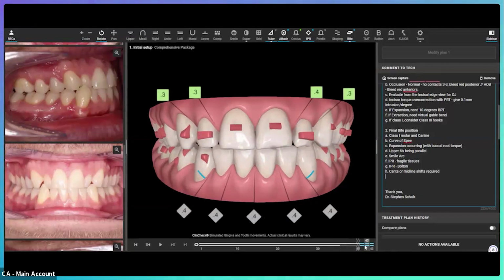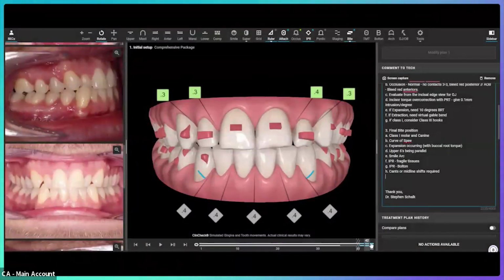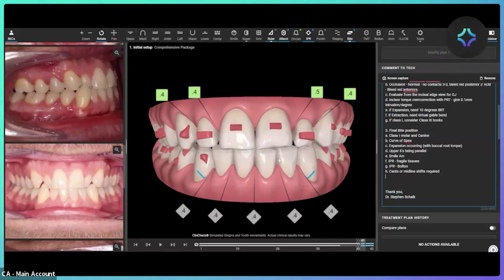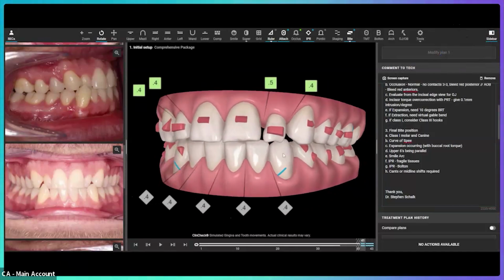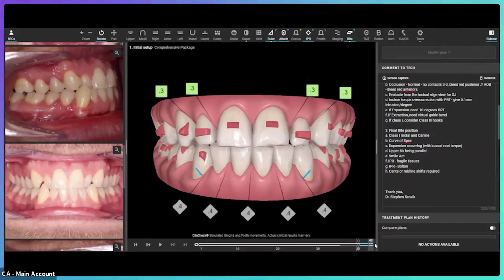Now in this case, I did something that I think is stupid. I'll call myself out: Steven from the past was an idiot. Here's what I did that was stupid. On the bottom, you see these blue 3 trays, which are overcorrection trays. Here's why this is stupid. I've asked the technicians to give me virtual C-chain, which tightens up the contacts between the teeth. But I've intentionally left space around that lateral incisor and around the other lateral incisor, because I want an extra millimeter of tooth width. Then I'm using this virtual C-chain to tighten up my contacts.